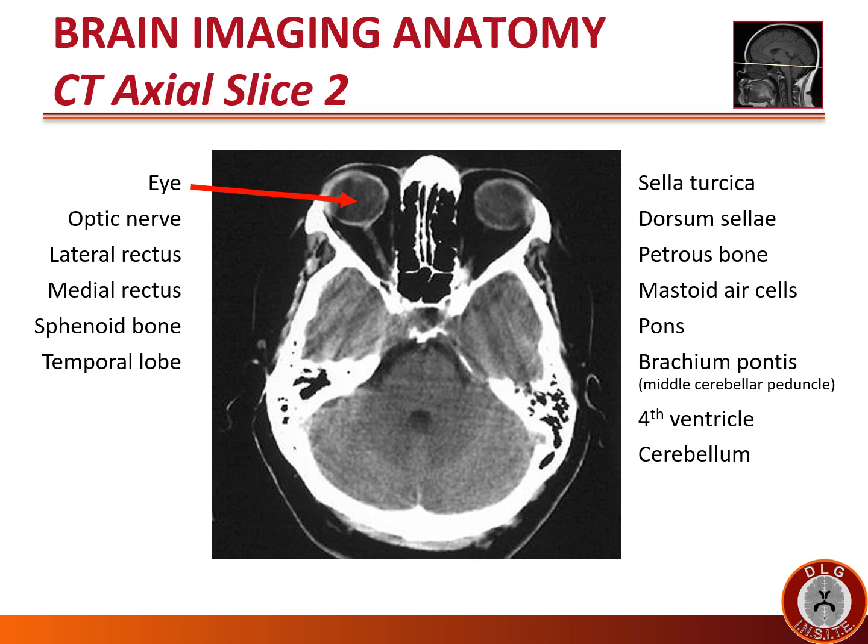The eyes are once again easy to identify. Note now that the image is slightly asymmetric. You can see the lens is still partially seen in the right eye and not seen at all. We're above the level of the lens in the left eye.